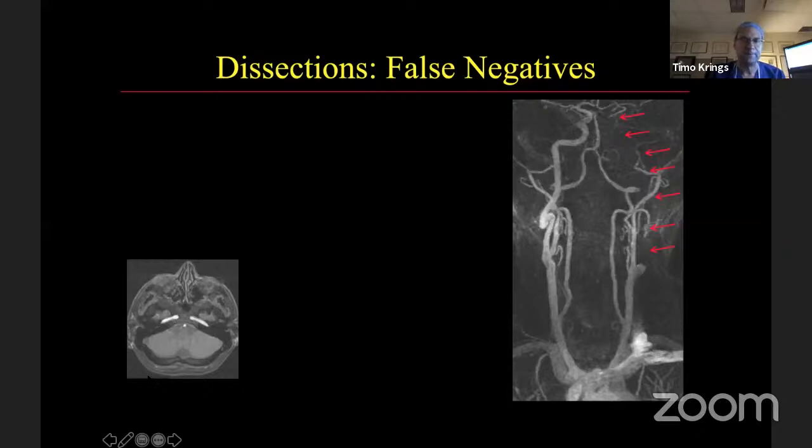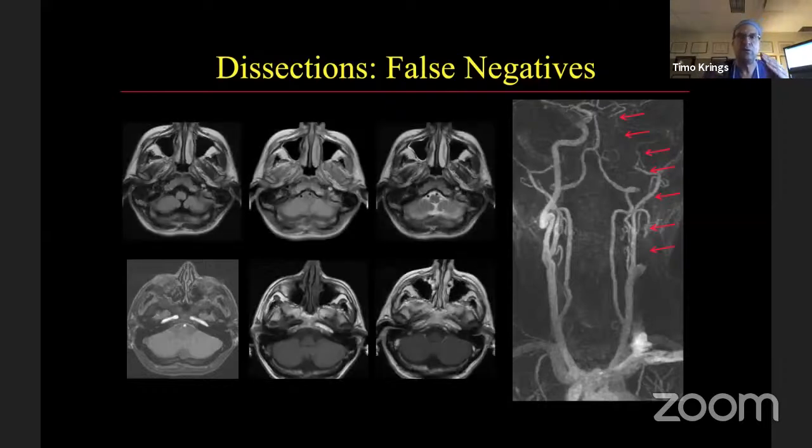Which technique is wrong? Is it the contrast enhanced MRA that demonstrates the missing vessel, or is it your time of flight MRA? And now remember that the time of flight MRA is intrinsically T1 weighted, which means that if you have a primary T1 hyperintense thrombus within the ICA, it may show up because of its T1 effect, not because of its time of flight effect.